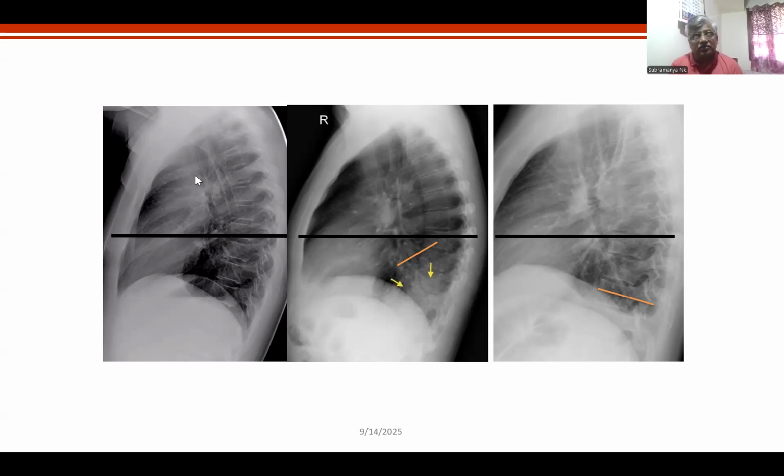Easy for you. Now look at this lateral X-ray, which is important to me. Anterior mediastinum, middle mediastinum, and retrocardiac, that is posterior mediastinum. Please focus on the points that I'm going to tell you. You start looking at the mediastinum. Retrosternal is often lymphoid tissues, thymus and others.